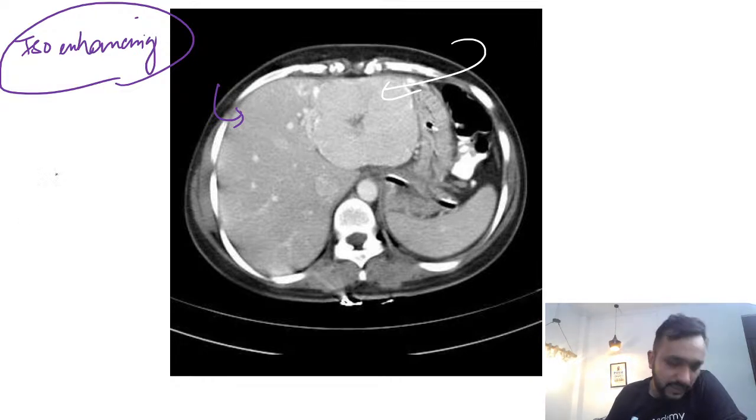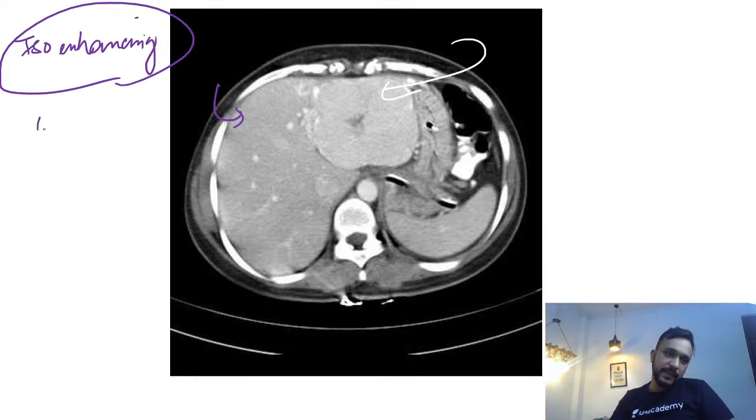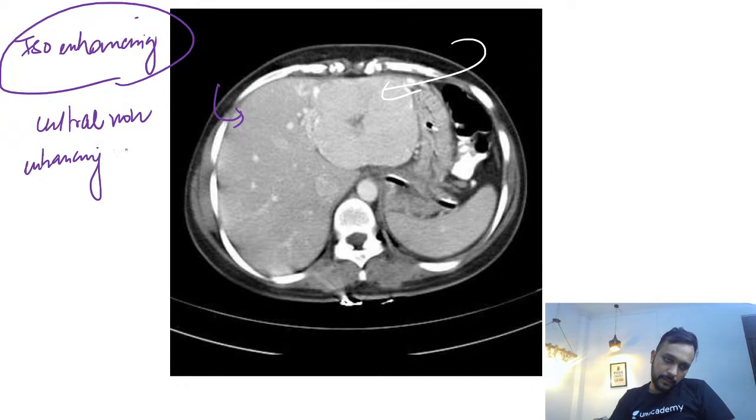Within this iso-enhancing lesion, there is a central non-enhancing area. This is your central scar appearance.